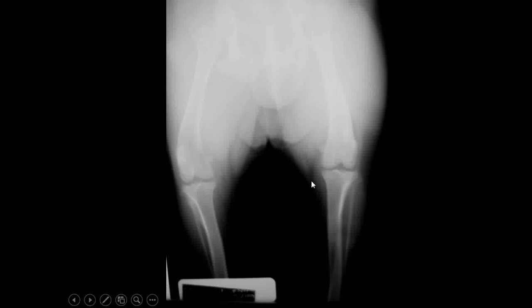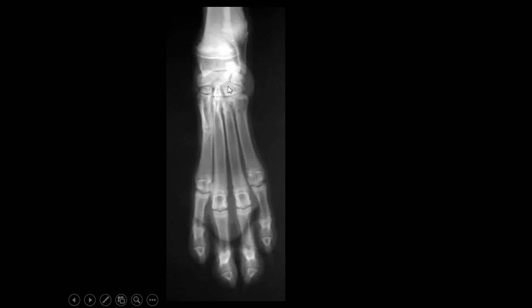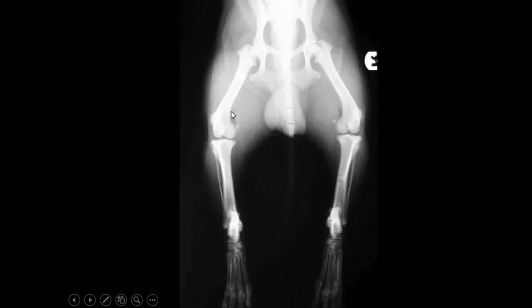Extremities, look at knees on dogs. The lateral knee, I guess, blurry. Carpus. Notice in a young dog, a few growth plates. Again, dog. Pelvis right here. Femur, tibia, fibula. There's the calcaneus, knees. These are pretty good. So dogs have what are called fabellae, which are sesamoid bones embedded in the tendons of origin of the gastrocnemius muscles.